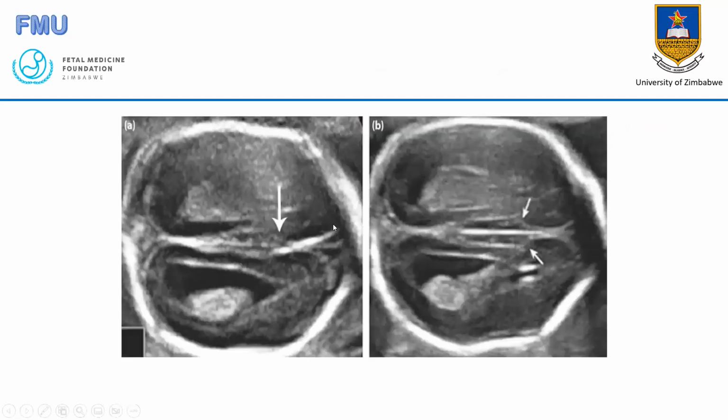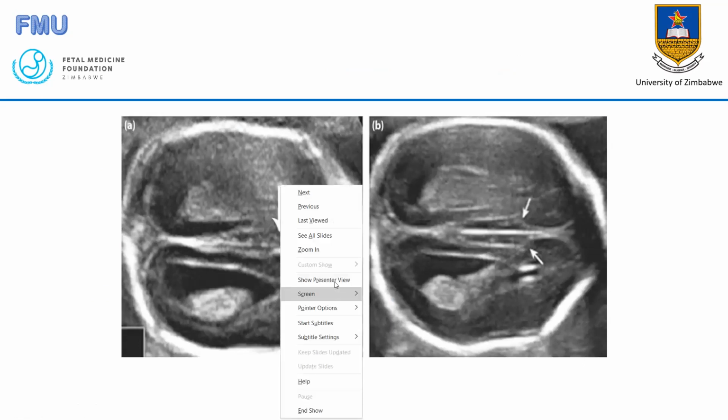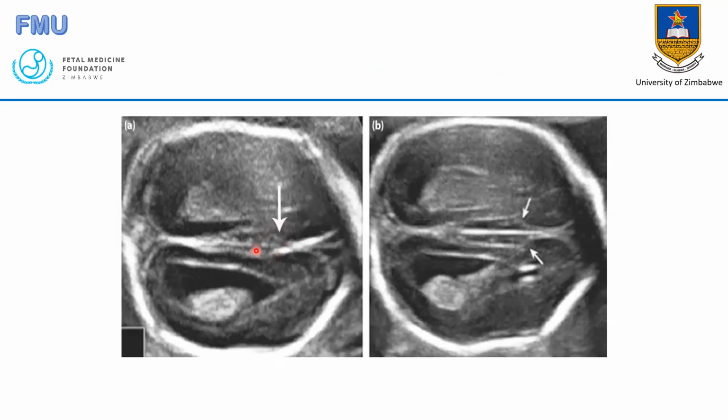Okay, right. So these are the images that you will see when you are doing your usual head circumference plane. You are going to miss the box of the cavum septum pellucidum, so there will be no box here. You know the image of the head circumference gives you a box of the cavum septum pellucidum, and you see the nice horns coming out on the side there.